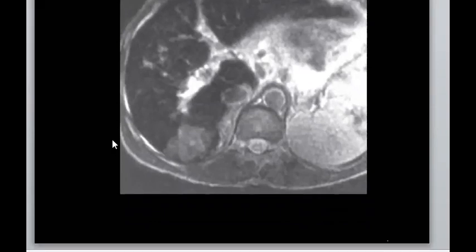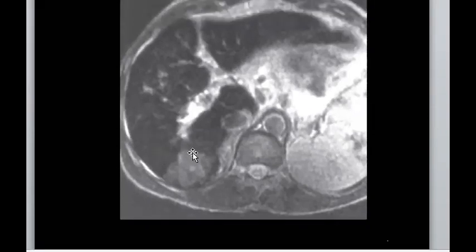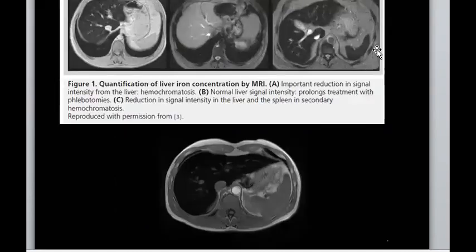Okay, so what do you think it could be, primary or secondary? What's the difference? Primary, do you like it in the MCQ questions? Which one is primary? Yeah, when it involves the spleen, it is secondary. When you find the low signal, it takes liver and spleen, because in the primary type, the spleen is not involved. Perfect. You agree? Everyone agree? Okay.